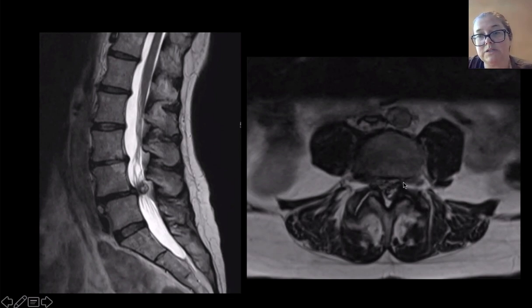So I would describe all of the degenerative change in terms of the disc, the facet, the flavum, and then say also that there's this large facet synovial cyst. All together, I've got moderate degree of stenosis, and then I would look at the neural foramen, obviously.